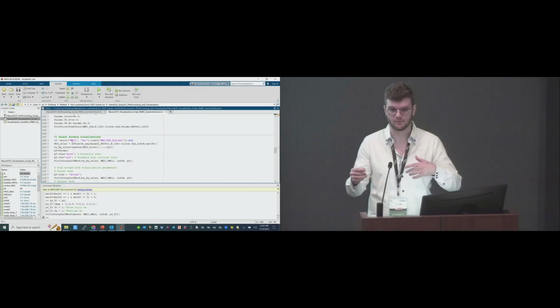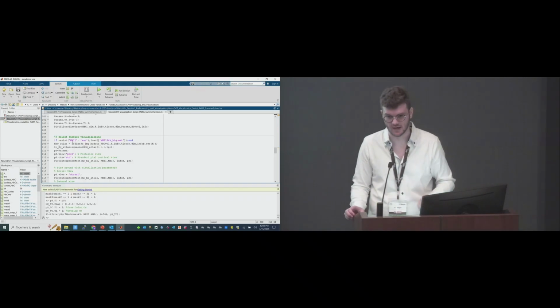And then you could crop the entire volume to the specific area of the brain that you wanted after that. Oh, okay.